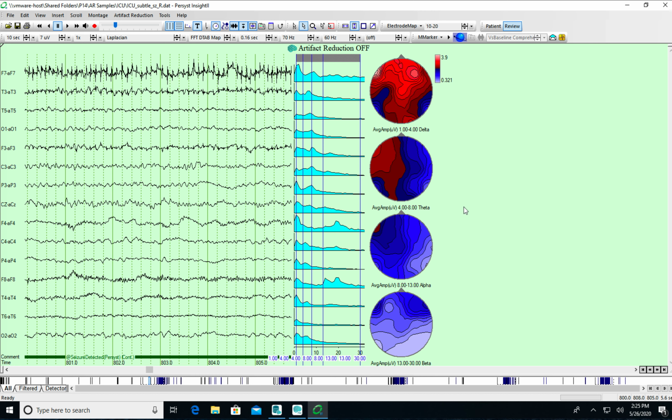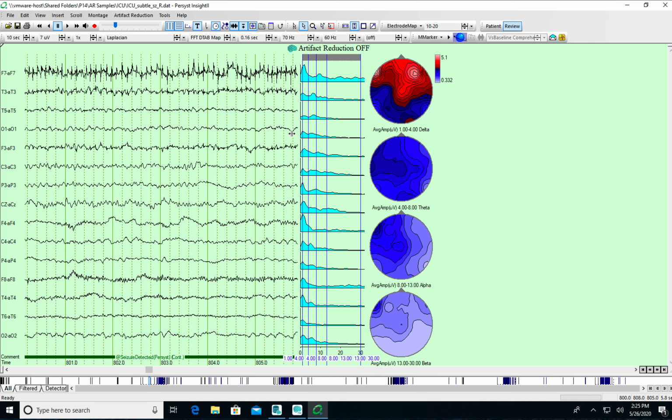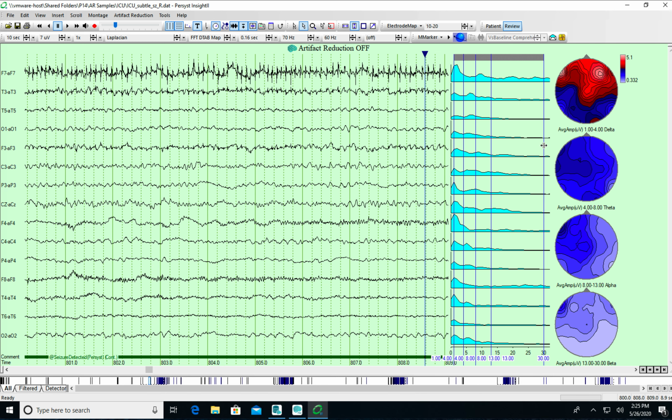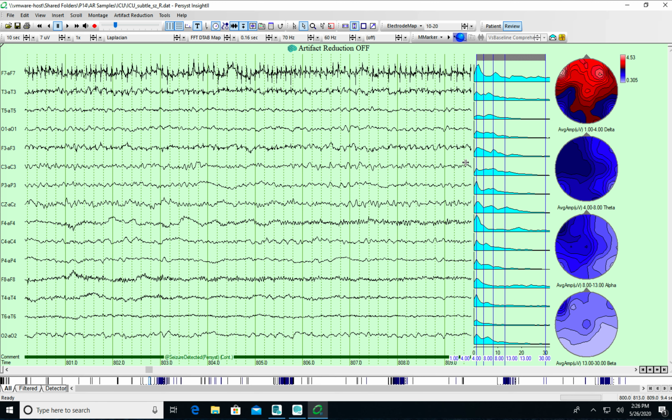So in the Insight 2 tool, we can move around here. We can get a double-headed cursor to move some of these things around. That one moves the left end of that trend. This one here becomes a two-headed cursor right there, and we can move that, and it'll slide the whole thing over. So let's do that. Those are invisible. You kind of have to mouse over them to see it turn into that two-headed piece. That'll let you set where that's going to be. And sometimes you might want it larger or smaller, depending on how much resolution you want to see in this display.